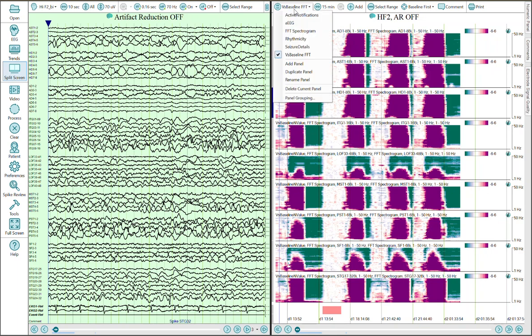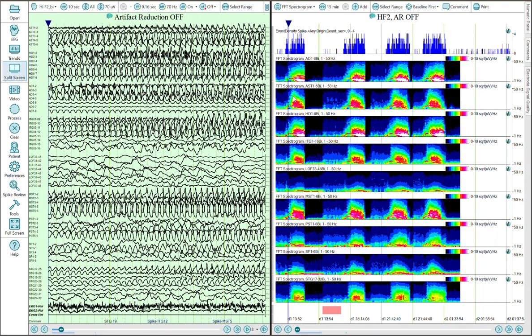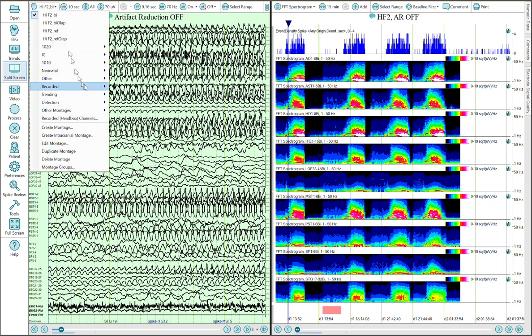And what we're going to do is really just use this to find the place of interest, and it's pretty easy to spot. These seizures are happening here. So without getting too far into the trends, because you can trend intracranial, these happen to be built by Hardware Group using montages that were created semi-automatically by the intracranial montage creator to create channel lists of hardware groups. So you don't end up with 200 trends, not very helpful. You end up with a subset of trends based on anatomically related channels.